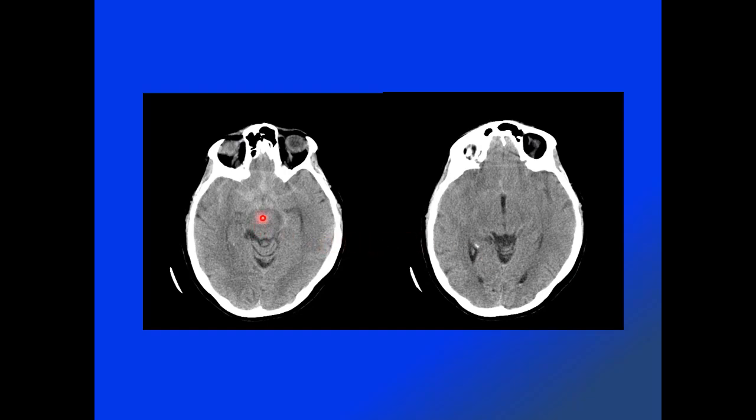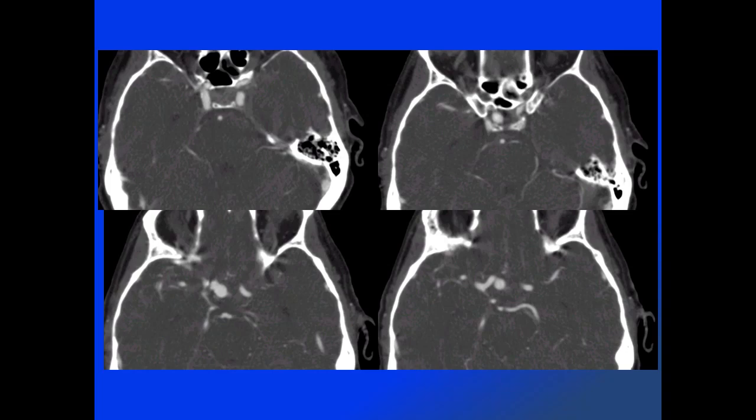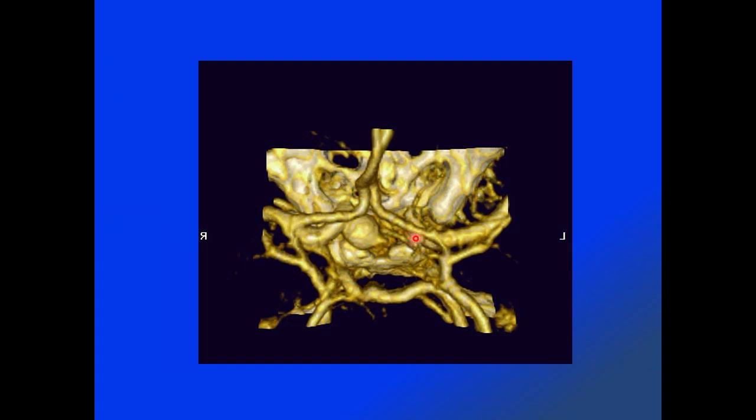A different patient who presents not acutely, but likely subacutely, with evidence of cerebral hemorrhage, which is not quite as dense as the cases we have just seen. The patient is noted to have a large aneurysm arising from the right supraclinoid ICA. Three-dimensional reconstruction images nicely demonstrate a large posterior communicating artery aneurysm.